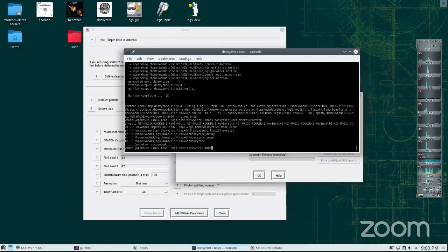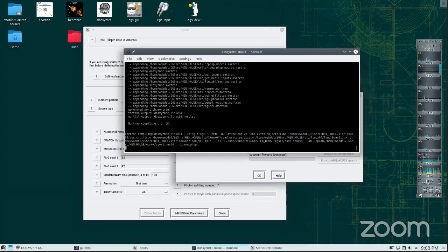Okay, so it's 2 hours now, and I believe for most of the people it has become late, especially in the Asian countries. It depends on your taste, it does not matter. I use OpenSUSE and Ubuntu. I like OpenSUSE, but if you want to use Ubuntu or OpenSUSE, that's up to you. But the installation is going to be a little different. The package names are a bit different than Ubuntu.